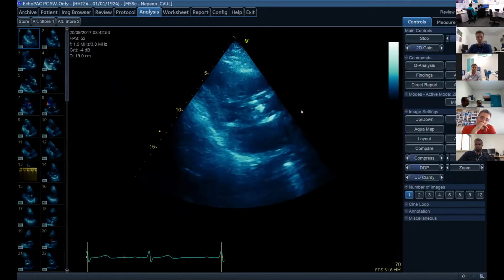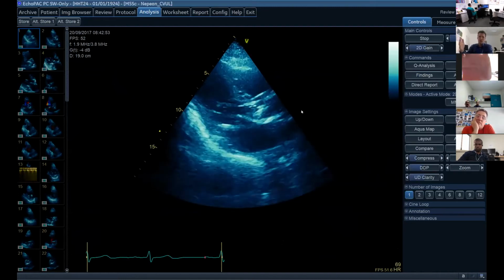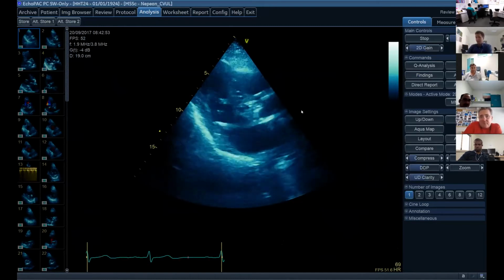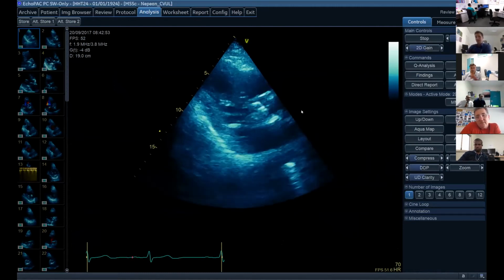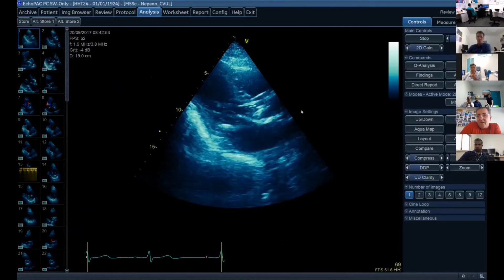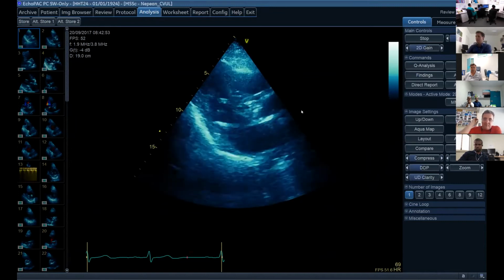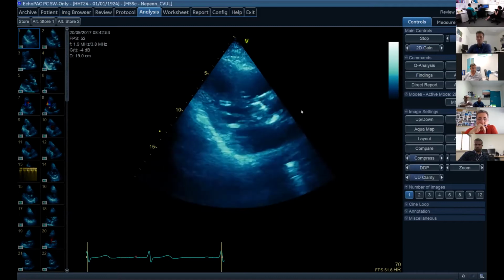And the kind of answer that I'd be expecting would be, we'd be saying that this is a 75-year-old guy who's hypotensive with a systolic murmur. We've done this echo. And I'd expect the candidate to look at this and say, because it's always going to be critical care directed, of course, well, I can see a thickened left ventricle that's got hyperdynamic systolic function, significant calcification of the aortic and mitral valve, indicating potential chronic degenerative changes.